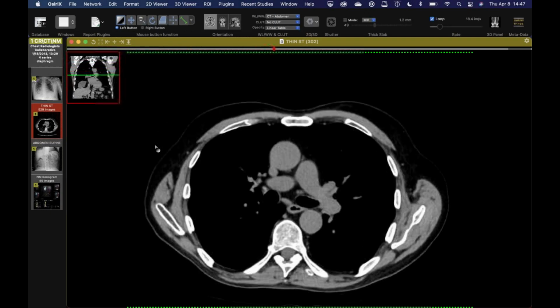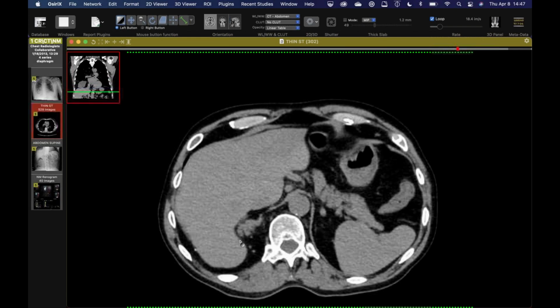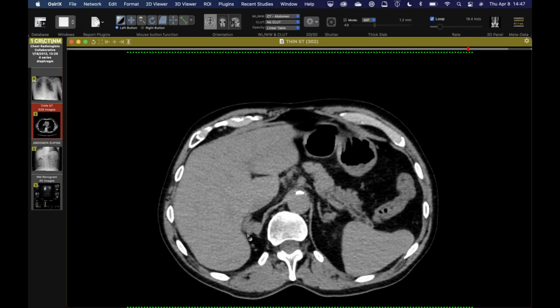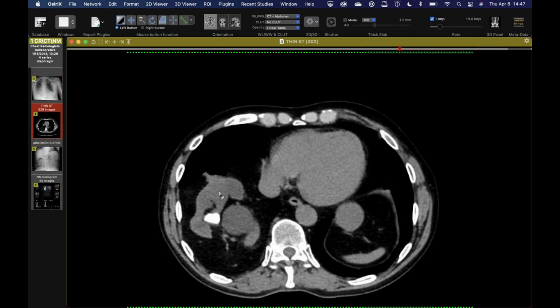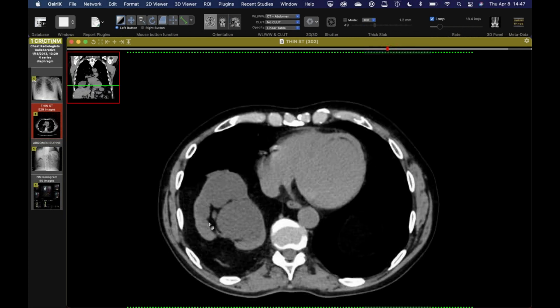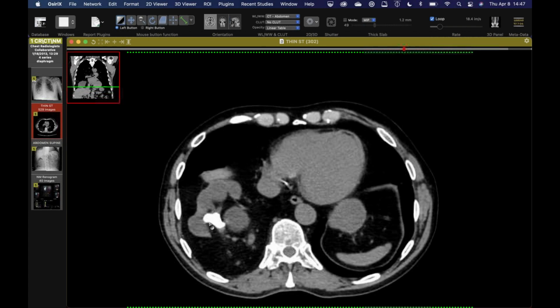That's what I wonder. You would think about that, because if you look at the neck, if you can figure out, this looks like the ureter maybe somewhere down in here, that maybe it was a chronic sort of, not quite a UPJ obstruction, but functioning like a UPJ obstruction, that the kidney became chronically obstructed, and then that led to stasis, parenchymal atrophy, and stone formation. I would think that would be the most likely thing, because that's a pretty small defect for such a big organ.